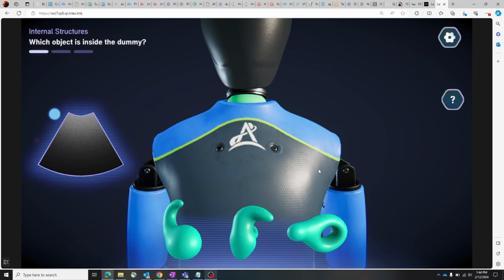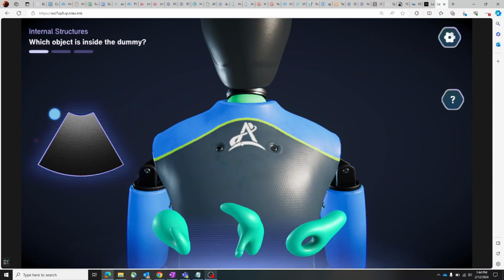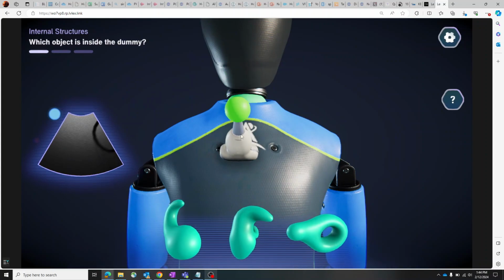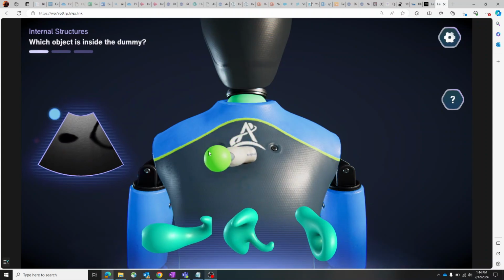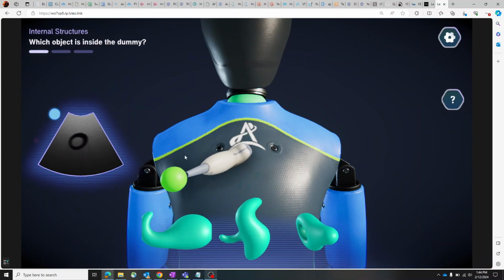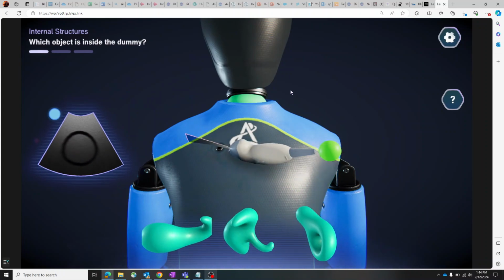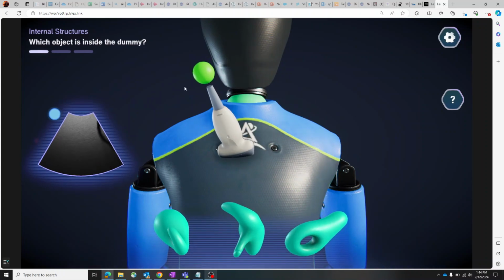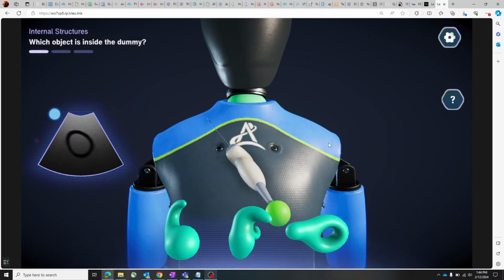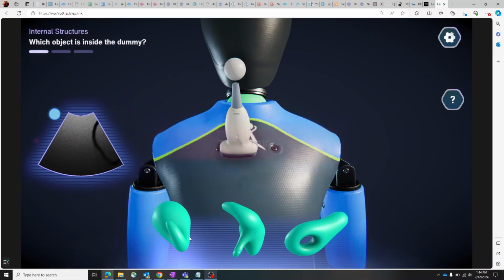And then next we're going to cover the Valsalva maneuver. This is going to expand the IJV. See how that looks on the ultrasound as well. This is meant to be a procedural guide where you're going to be practicing these maneuvers as you go through this. Next, we're going to teach how you should be breathing while you're performing the assessment.